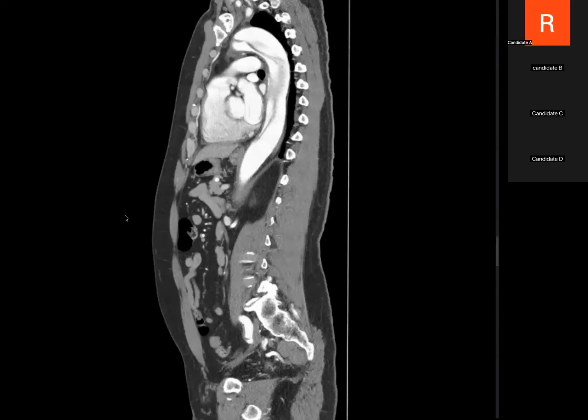Post interventional procedure. This patient did not have any recent interventions. Any thromboembolism. Okay, so if you suspect that, what is your next step? I would like to get a CT angiography. I don't have an angiogram, but I think I have the next best thing. If you let go, so this is the CT sagittal of the same patient.